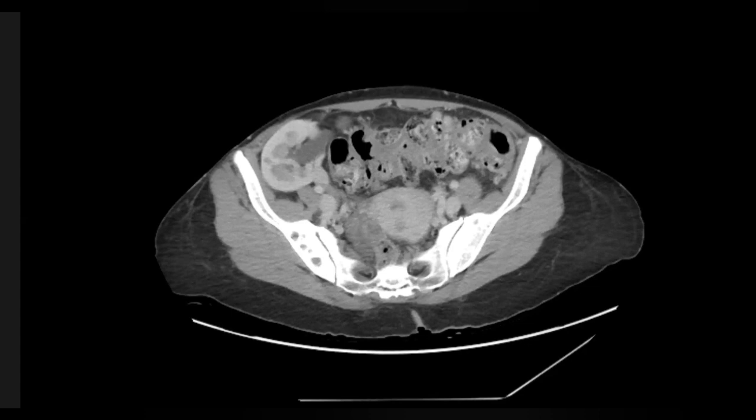When you pick up the hint from the image and tell the physician the patient has a history of so and so, believe me, he will trust you forever. Sometimes the physician doesn't see the patient and requests CT and labs and decides from the results, even without examination. If you see thinning of the muscles here, while this muscle is normal, that is indicating the previous history. So this patient, yes, has a history of transplant.